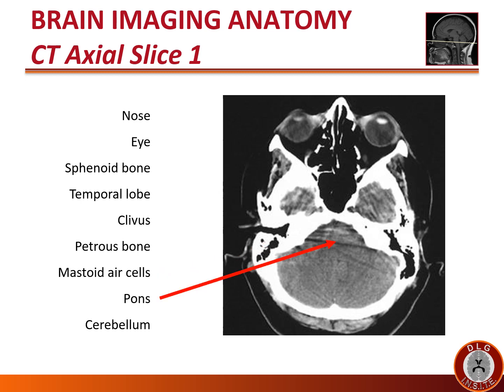The pons is seen in the center of this slice. Remember, the word pons means bridge in Latin, and it bridges the two other components of the brainstem, the medulla below it and the midbrain above it. When you see the pons on an axial image, of course, behind it lies the cerebellum. Please also note that the cerebellum crosses the midline. There is no fissure in between the two sides of the cerebellum.